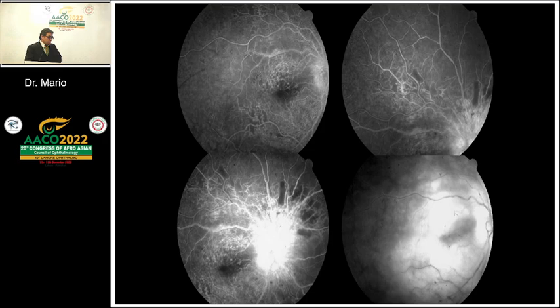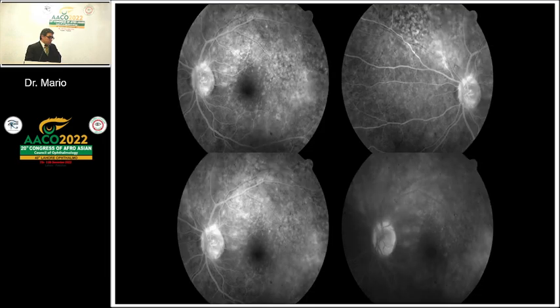We didn't know what to do. There is something interesting. Maybe those who are familiar with this image are suspecting something. But I'm not going to tell it, to not spoil the case. This image has a pattern that is now recognizable, but at that time it wasn't described yet.